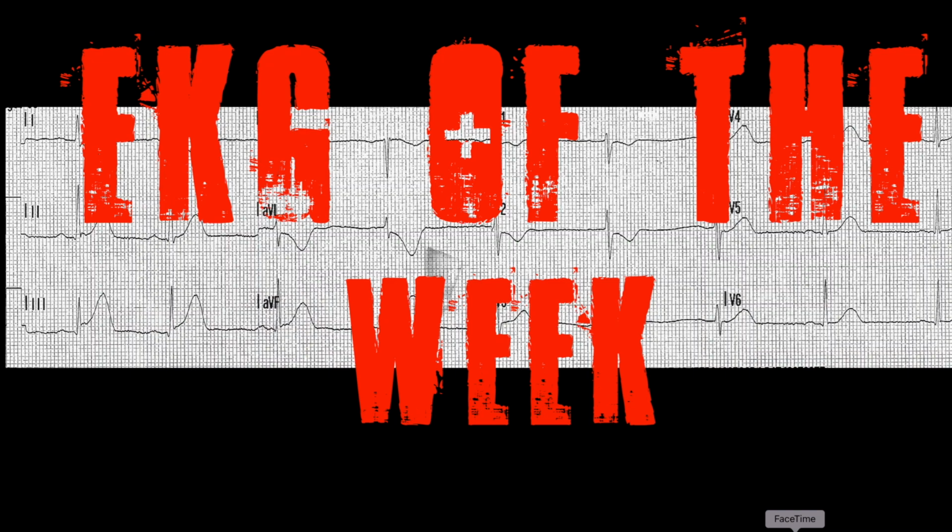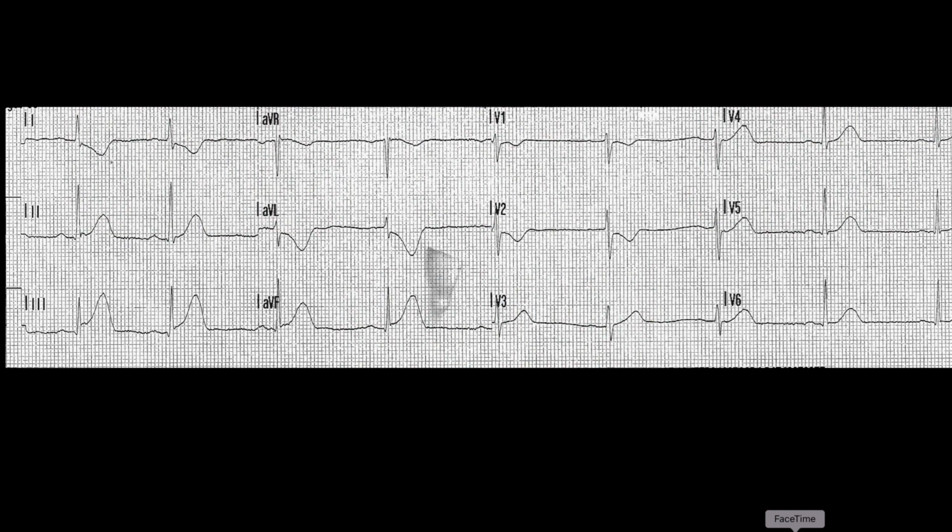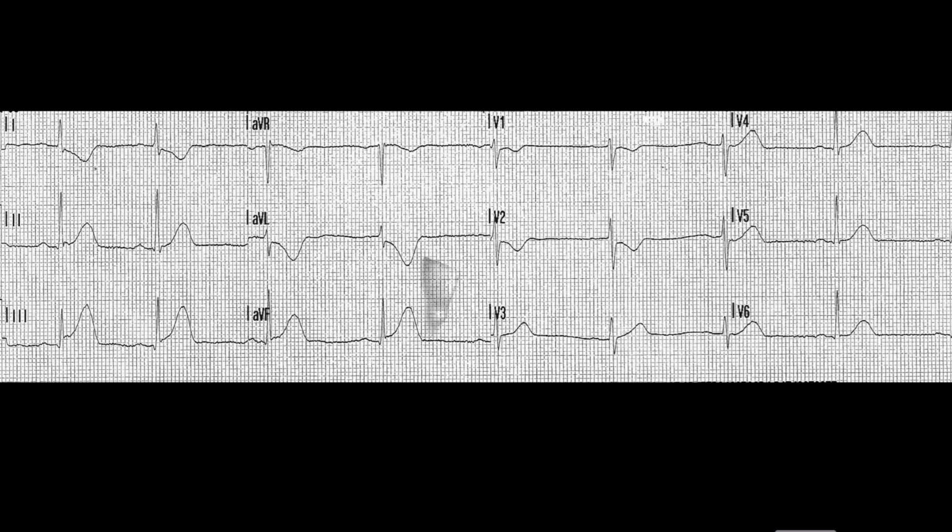EKG of the week. Let's run through another real-life EKG. Take a second, as usual, take a gander at this EKG and come up with your interpretation. And when you have it, then start the video again and we'll run through it. Let's walk through this guy.